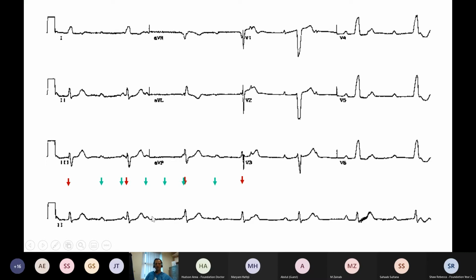Bit odd that you can't see one here in this nice flat section, but you just have to accept that, you know, the ECGs are not always wonderfully clear. So this does look similar, Joseph, to 2-to-1 heart block, but it looks similar in the QRS being regular and slow. What is completely different is this total lack of relationship.